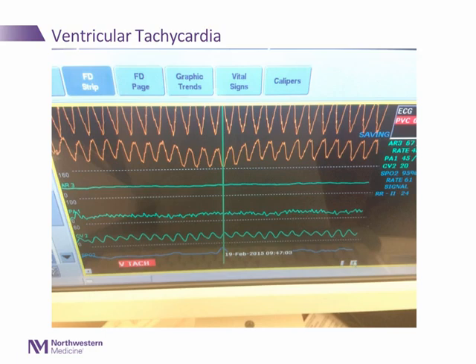In this example of a real ventricular tachycardia, notice that the arterial line waveform is flatlined, as is the oxygen saturation waveform, suggesting a true clinical compromise. If the event were artifact, the oxygen and arterial waveforms would not have been affected.